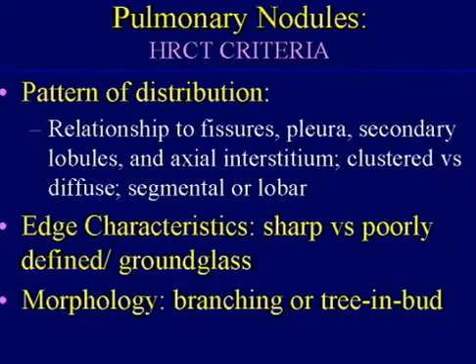One of the first steps for any of these images is to try to decide what you think the primary thing going on is. Is it diffuse haziness in the lung? Is it increased lines or reticulation? Are there nodules? And frequently a lot of these things will coexist. So you have to make a judgment about what you think the primary problem is and then use that as a point of departure.